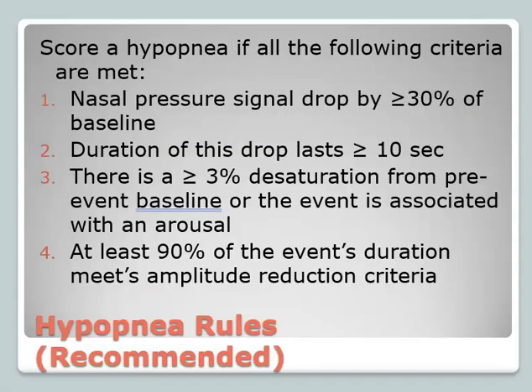Hypopnea. So you're looking at your nasal pressure signal. You need to have a drop by about 30% that lasts at least 10 seconds, and in addition causes a 3% desaturation, or the event is associated with an arousal. Now this second part of it, the event is associated with an arousal, is a new updated version to all of our AASM manual rules. Some labs do not go by this. You've got to check with the lab that you're at.